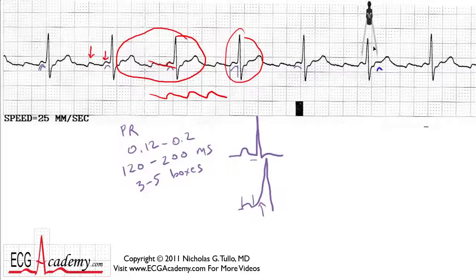And then if you measure on over, you see that there's actually a bump on the very beginning portion of the T wave. And if you put your caliper lines on that, then you're reading the end of the T wave. And if you measure out after that, you see the next bump here, which is a flutter wave, occurs on time.